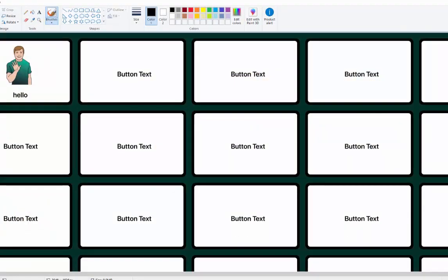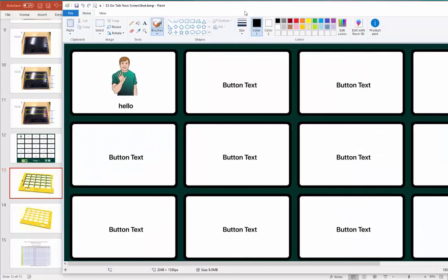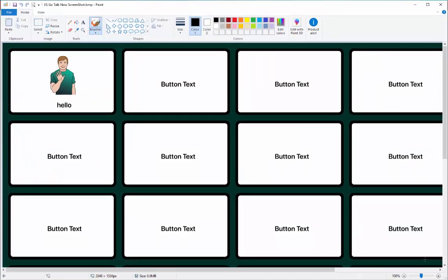And the easiest way to do that is to have a screenshot. Here I'm showing you Microsoft Paint. There are graphics programs you could use on Mac as well. I think I've documented those on the website. If not, I will soon. But the most important thing that the graphics program has to be able to do is show the full pixel image of the screenshot.